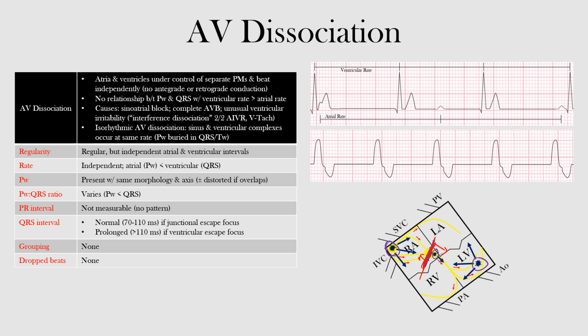towards each other. Okay, so if you look here, let's erase what we have going on. We're saying there's two different foci, so imagine this one here in the sinus node, and then we have one here in the ventricles. Note that they're spreading toward each other, but in opposite directions. So this is heading in that direction, and one is heading in the other direction from the ventricles. We call this contradirectional interference. And so interference dissociation is simply when there is a repetitive contradirectional interference, which occurs in accelerated idioventricular rhythm or VTAC. Anyways, a little more advanced stuff, but hopefully that makes sense, okay?